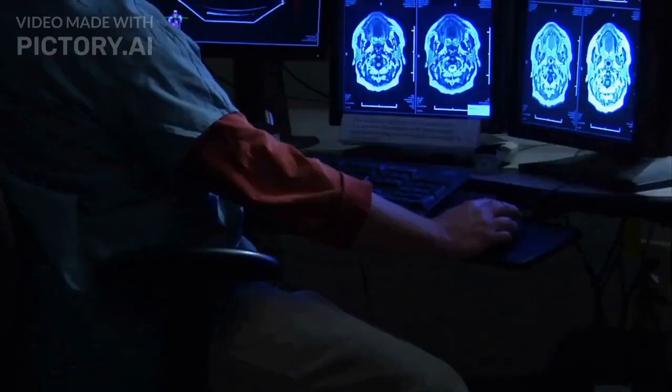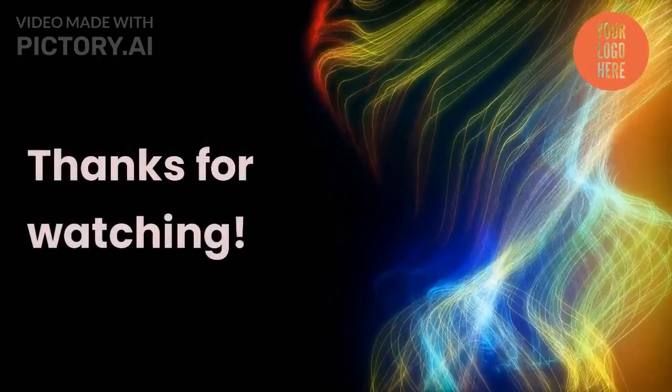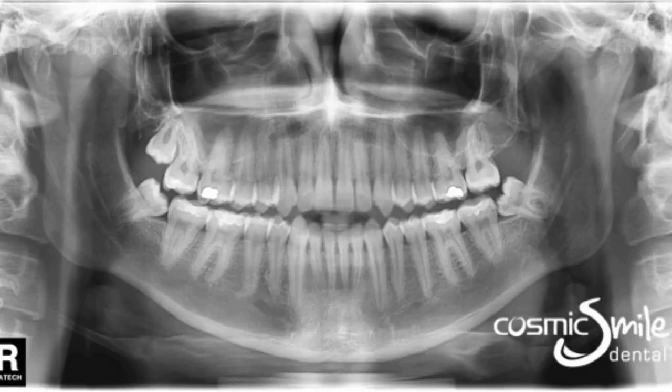Then come the landmarks, which we have already discussed. Any periapical pathologies can be clearly seen as radiolucency, and any restoration can be clearly seen as radiopacities, lighter in shade. And obviously with all these findings you have to present the bone loss, whether it is vertical bone loss or horizontal bone loss, as in this radiograph we can easily identify in both the wisdom teeth, which are mesially angulated, 4-8 and 3-8, there is proximal or vertical bone loss mesial to the 4-8 and 3-8.